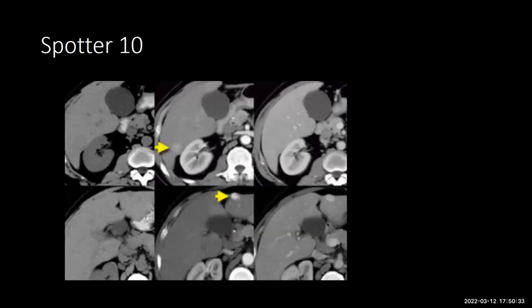So this one last two again to Chaitanya. There are two lesions. The upper, there is one lesion and lower there is one lesion. This is a slide I've taken from Radiology Assistant. I liked it very much, so I just lifted it. So what do you think is happening here?